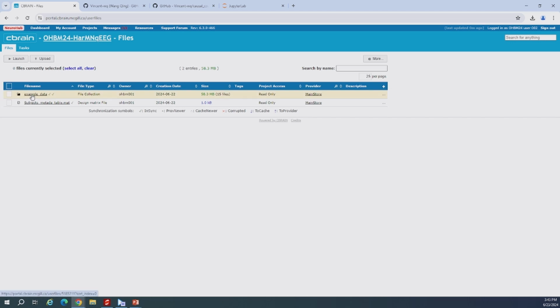And we can also have an additional table. In this case, we use MATLAB, but this can be an Excel table or CSV file. This table, we will see later, contains additional information about the subject, because many times the EEG comes without the age of the subject, for example, or without the sex, or without other data. If we need this information for the analysis, we have this option where for each subject you put all the additional information we need.